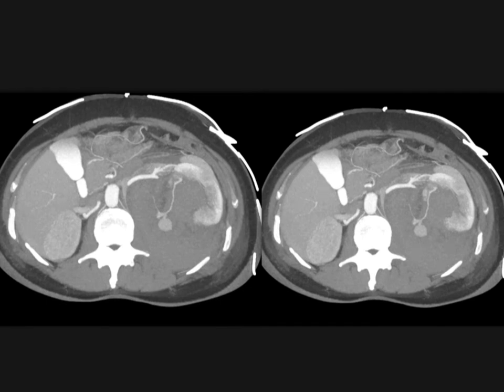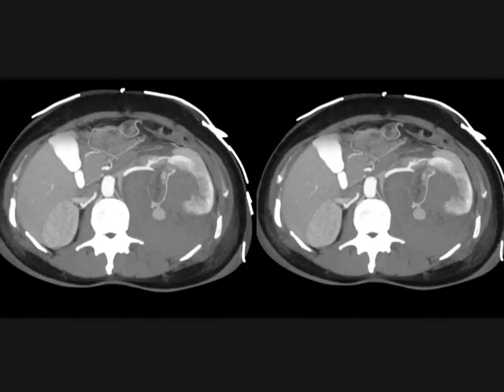You can see there was the patient's aneurysm. That bled is nicely shown centrally by the left kidney. And here it is with MIP imaging. So you can see active bleeding in this patient with a spontaneous AML, a very large AML. Again, people would say 5, now they say 4 cm. You need to do something about the lesion. This was well over 10, so it was a lesion whose time had come.